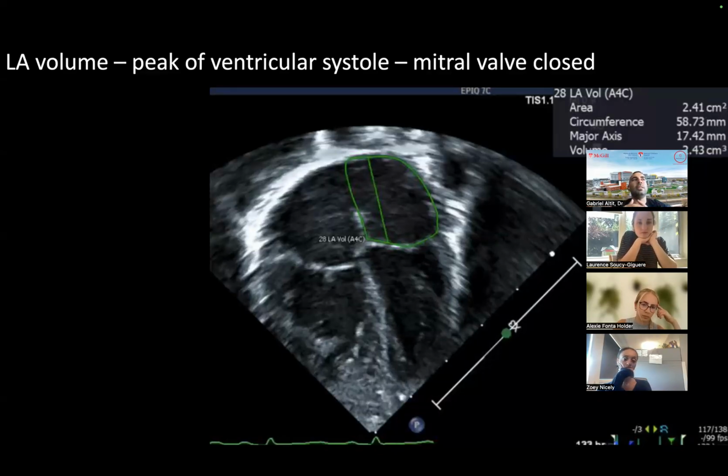Okay. So sometimes I say, for example, patients who will undergo some courses of steroids, and we know steroids make them at risk of developing ventricular hypertrophy. And often one of the questions we get is, is there significant LV hypertrophy? Of course, when you have large PDAs with a lot of left atrial preload, which eventually fills up your LV and makes your LV super well preloaded, maybe it's going to thin out the LV cavity, and whatever hypertrophy there was, you may not see it as well just because you have so much preload.